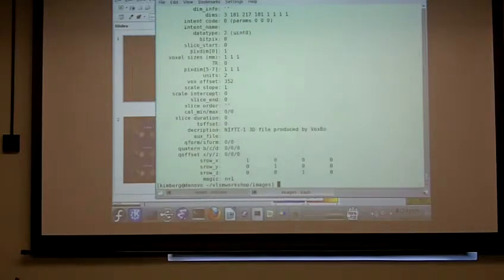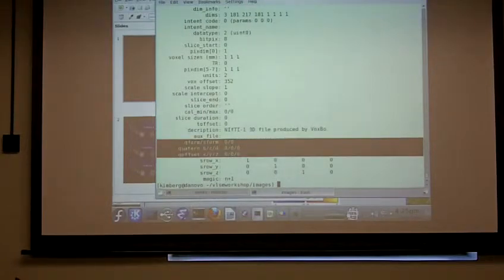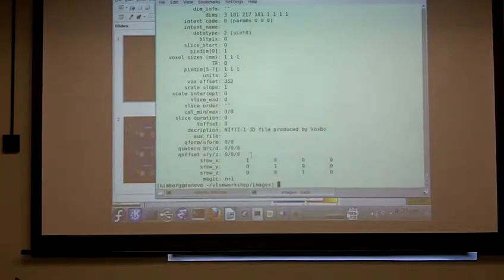So that matrix is actually the same thing you get when you type print header in ANTs tools. But yeah, this is the whole Nifty header. So these are the transformation matrices. And these two rows are the other bits of header information that are sometimes used, sometimes not.